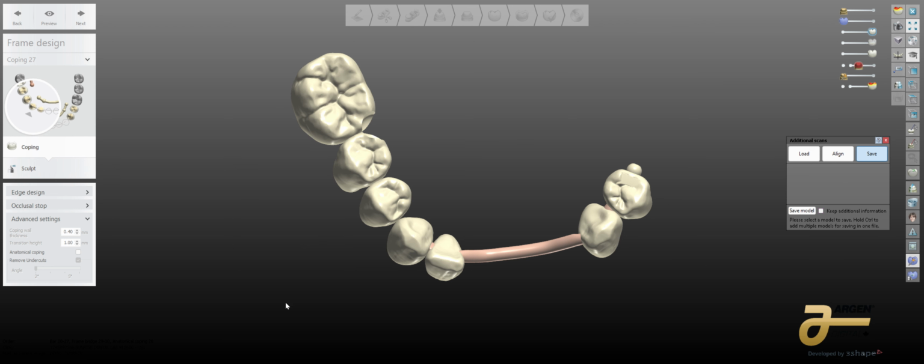You're used to bringing in models in here, but all of these assets are savable as well. Say if I wanted to click this and then Control-click the other one. Now I have the two full contours that are identical in the design space, right? So I have this pattern that I could do a separation from rather easily in outside software if I wanted to.